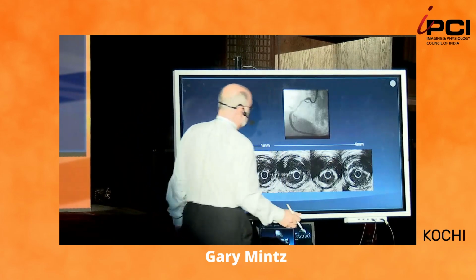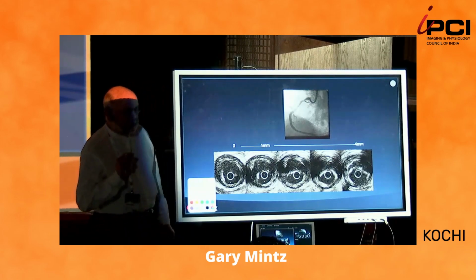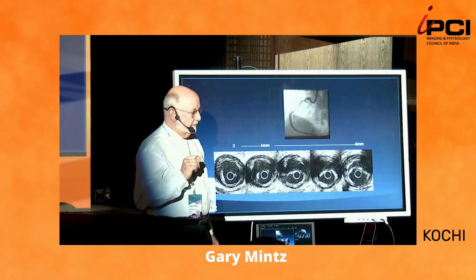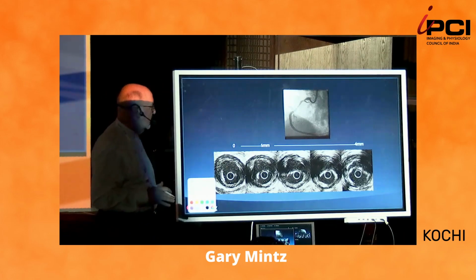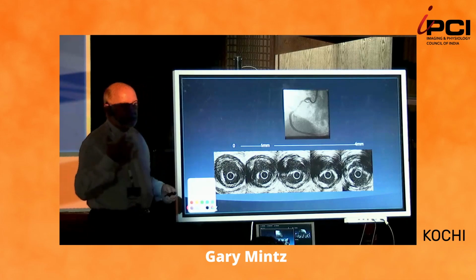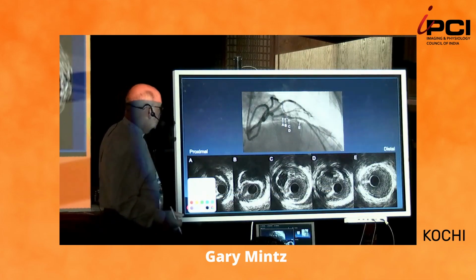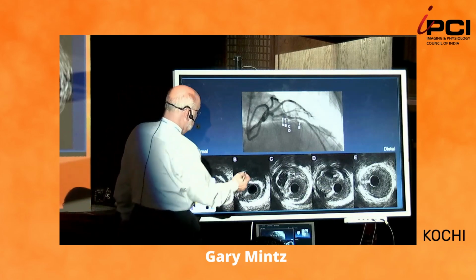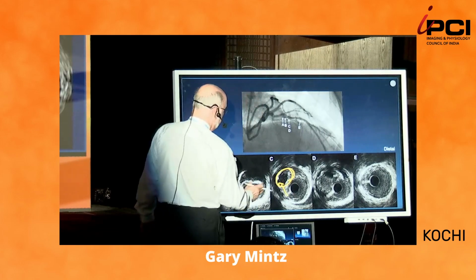The most common cause of acute coronary syndrome, although I think the frequency is probably going down as the frequency of erosions goes up, and I'm not talking about India, I'm just talking about globally, because that's somewhat related to patient age and being on statins and a lot of other things. Another example of a plaque rupture, look for the lateral break and the cavity, okay?